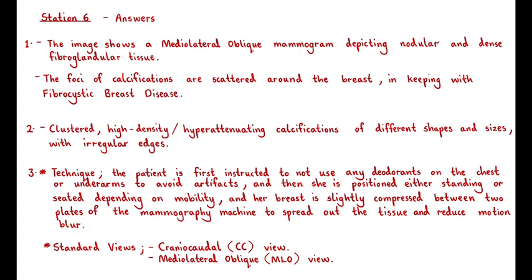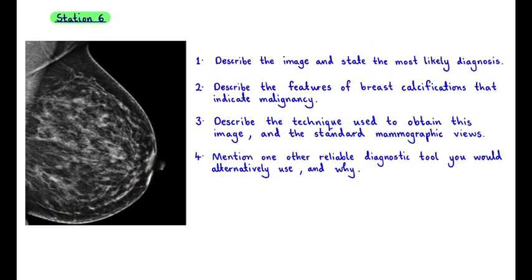Then the standard views of a mammogram include craniocaudal view and mediolateral oblique view. So this particular example showed us a mediolateral oblique view of a mammogram.